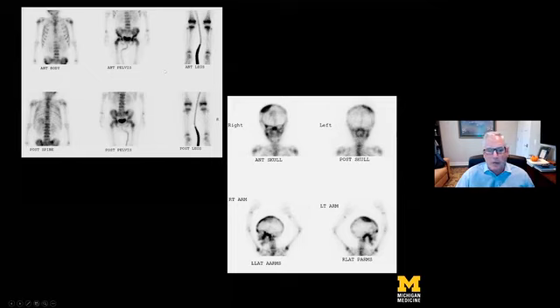Now, in general, in younger children, looking for metastatic disease, especially in neuroblastoma, can be difficult on bone scintigraphy because the metaphyses and the physes are quite active and therefore have significant uptake of radiotracer. The issue is how much is too much, and can you truly tell? It takes some experience as to whether or not there's metastatic disease within the ends of the long bones. And metaphyseal metastatic disease, that's not uncommon. That's a good place for metastatic disease to set up shop.